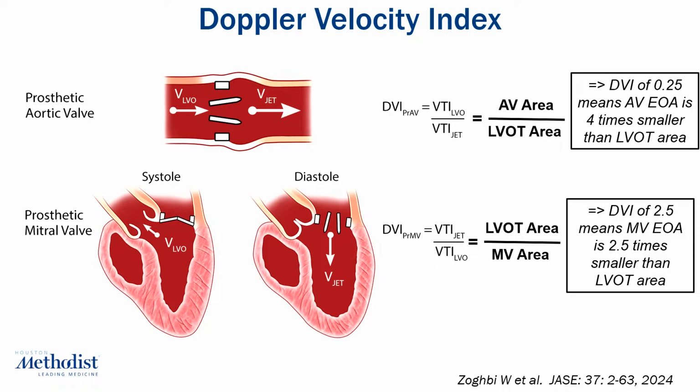However, big asterisk here: that statement is correct only if you measure the LVOT diameter and the LVOT TVI in the same location.